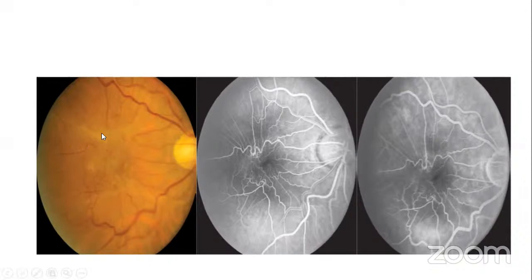The vessels here are not meant to be scalloped. It's the epiretinal membrane that is dragging them, okay? The way they are dragged, you see the tortuosity of the vessels induced by the membrane. So this is your fundus photo here. This follows the normal pattern of the maculopathy, the pulling here. Now, which phase is this? That's the question. The arteries are almost empty now, and you're transitioning towards the full venous phase.